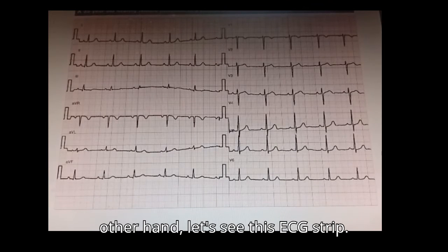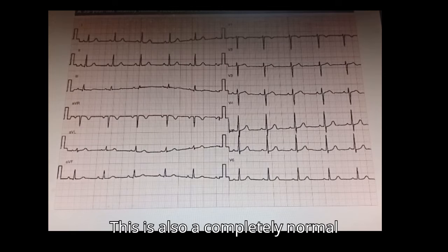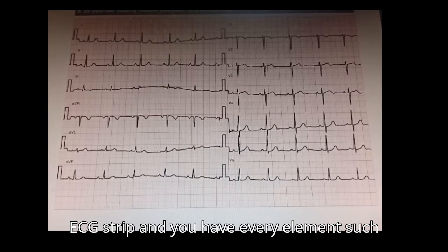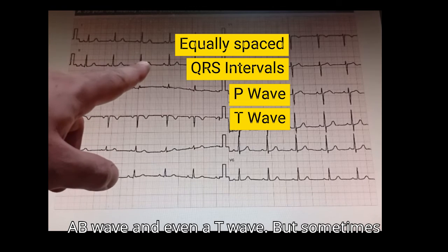On the other hand, let's see this ECG strip. What diagnosis would you make now? This is also a completely normal ECG strip. You have every element such as equally spaced QRS intervals, a P wave, and even a T wave.